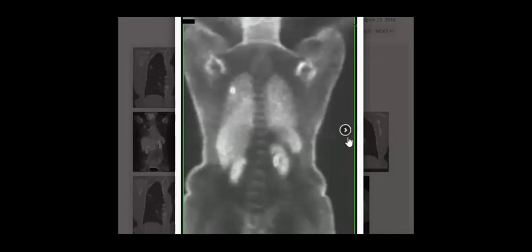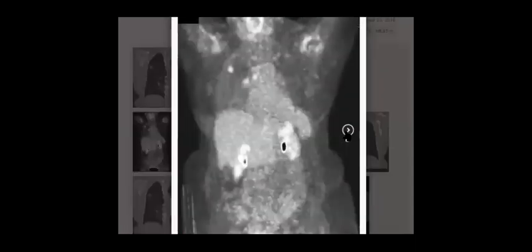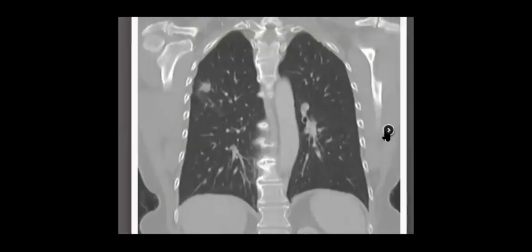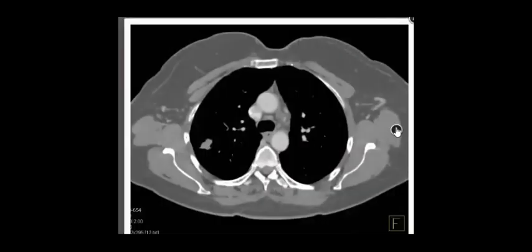So what will it be, until proved otherwise? Yeah, differential diagnosis, and you will put at the top of your differential pulmonary or bronchogenic cancer. Yes. Bronchogenic carcinoma.